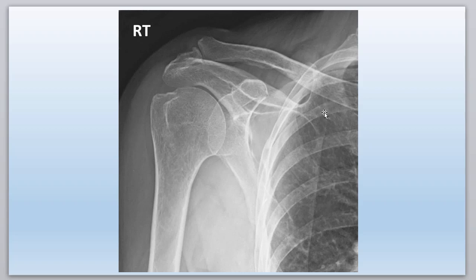Then we can see a line running right down here. See this line? That's the vertebral border of the scapula, or the medial border of the scapula. We can see this one over here, which kind of makes up the pit in the armpit region. That's the axillary border, or the lateral border of the scapula. We can't really see the inferior angle on this image. We can see the spine. Remember, here's the root of the scapula, right here. Okay, I think that takes care of that.